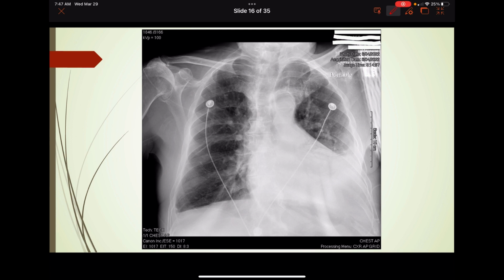And another chest here. This is an interesting one. This is one of mine that I had. I believe, if I remember right, this is one that I did a thoracentesis on and drain. You can see, let me go back here. A for airway, coming down here. Here's a carina. Nothing in the trachea. And B for bones. Bones are okay, I believe. Let me look a little closer here. So I don't see anything.